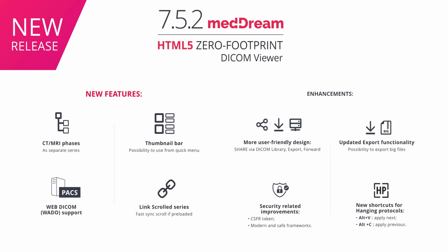The new version of MedDream DICOM Viewer supports WebDICOM WADO. Now there is a possibility to connect with any PACS that supports WADO integration. Also, in this release, security-related improvements were implemented, such as CSRF token and modern, safe frameworks. Watch this video tutorial for quick demonstrations of the most important new features.